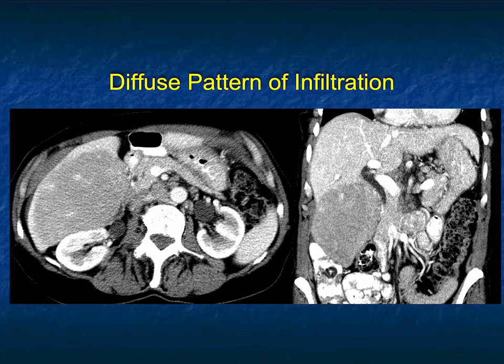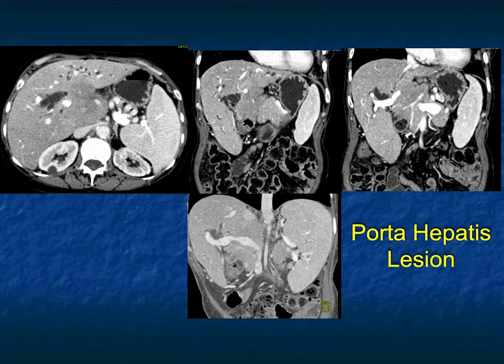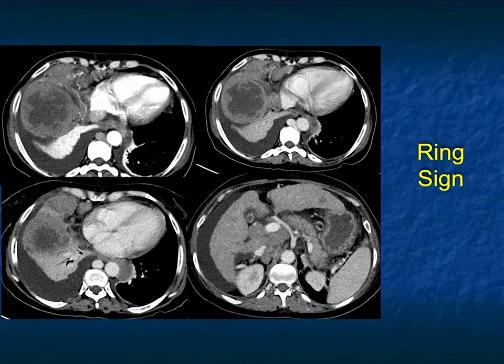That large mass in the right lobe of the liver, you would have said cholangio, though they're usually more central. You would have said hepatoma. In a younger patient, hepatocellular, fibrolamellar are all possibilities. And the porta hepatis, the encasement, the dilated ducts. In this situation, cholangio often is the first thing that comes to your mind, and that's reasonable. But think about lymphoma, particularly when you see the images with the vessel encasement where it's really soft infiltration.